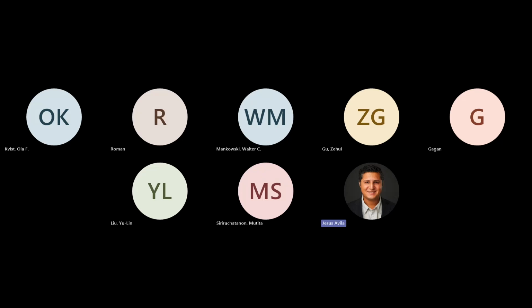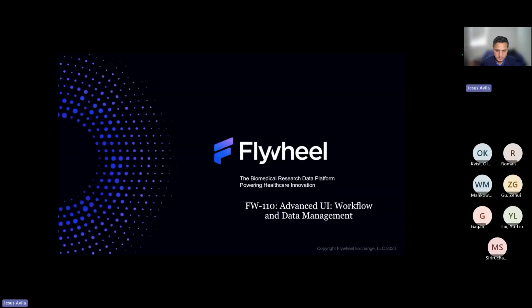All right. This is Flywheel 110: Advanced User Interface, Workflow, and Data Management. We've already covered Flywheel 101 with some, if not most, of you. And for the admins like Justin, Yulin, and Sachin, we did Flywheel 301 for the admin training. Some of this covers some of that 301, but this will be mostly new topics just relating to the UI and how to take advantage of it.